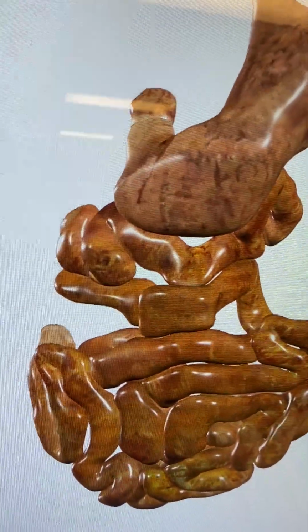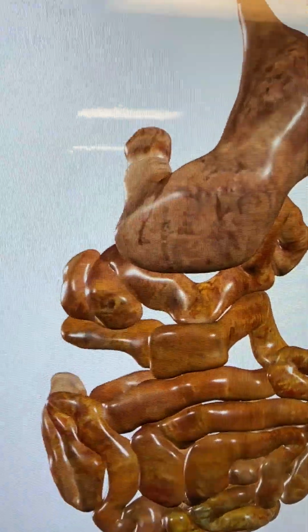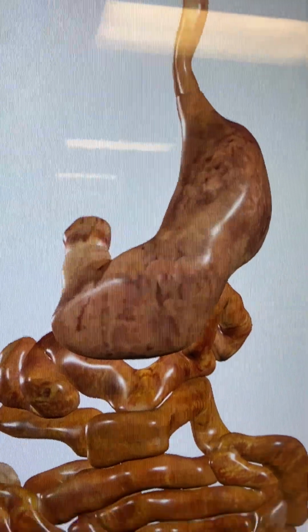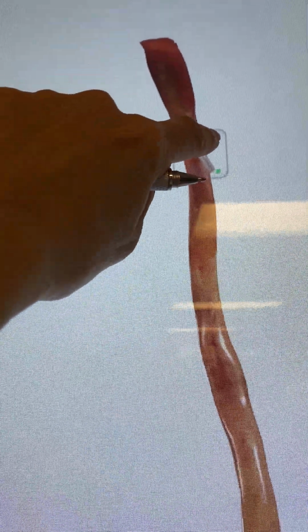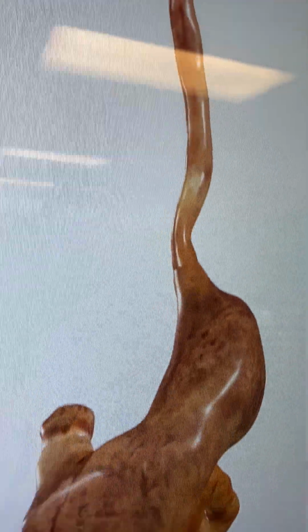So it will take a curved structure and show it in a flat 2D plane. I tap again because I changed it. I don't know if I showed it on the camera. I came here and tapped it again. I want to make sure it's on and working.